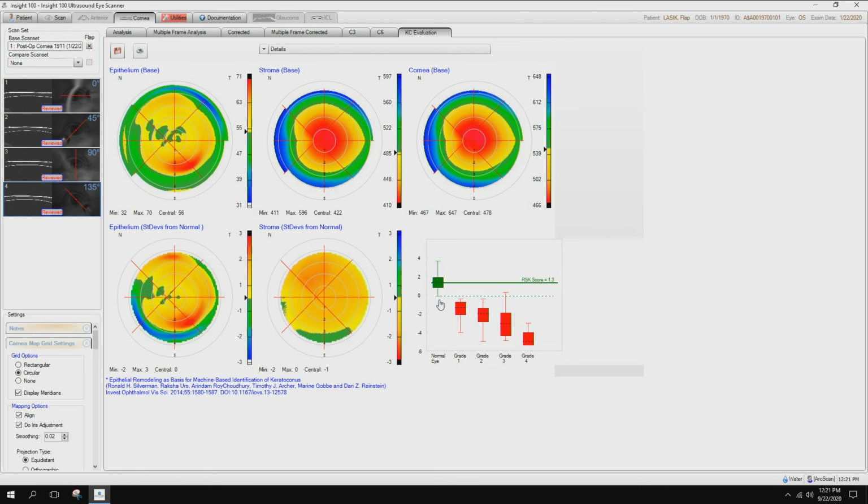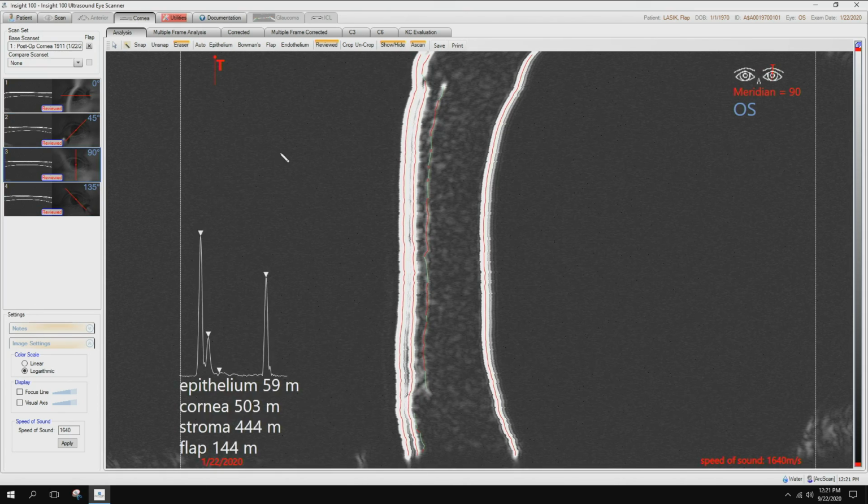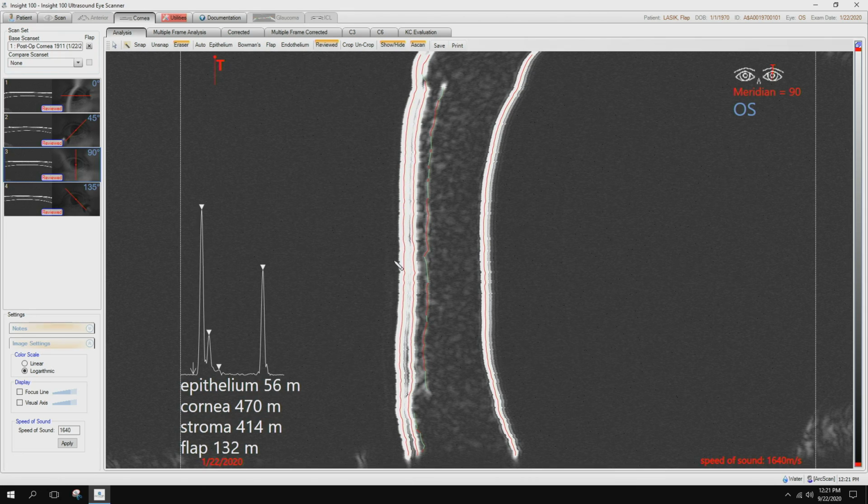So this is a quick walkthrough. Again, if you wanted to go back and take a look at anything that you're looking at here, like why is this a little bit thinner over here, you can go back to the analysis and see the various maps. Use your ArcScan and walk up and down to see exactly what that is.